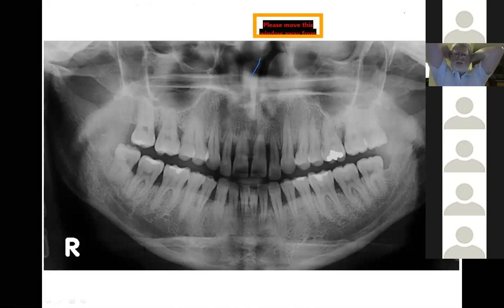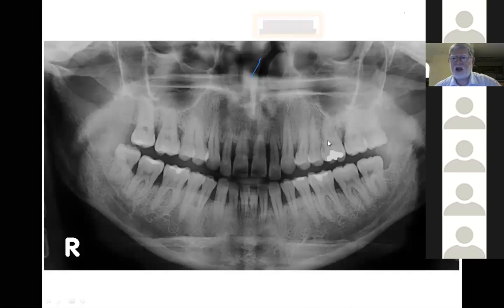Interesting here, what main issue for this patient? Okay, yeah. We've got severe perio, localized perio, bruxism, certainly you can look at the wear there. It can lead to quicker bone loss than on somebody who's not a bruxist. Heavy chewing forces in the presence of inflammation does accelerate bone loss.